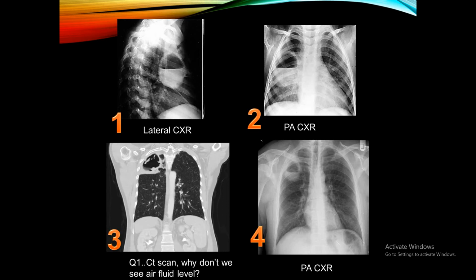الصورة رقم 3 اللي هي CT scan والسؤال why don't we see air fluid level here بالرغم من أنه this is lung abscess. هذا سؤال تفكرون بينه وتجاوبون إن شاء الله.